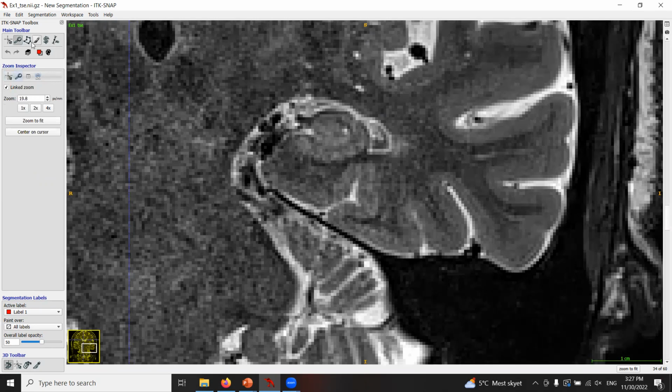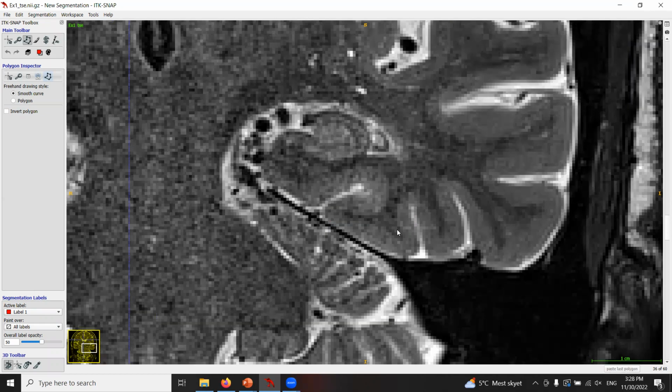Just to give you an idea what I would be looking at. So for this image, I'm just going for this hemisphere now. I want to see the dark band, so I drew on it here. And the outer borders. So I'm just showing you, when I would QC the MRI, I would not normally do this, but just to show you what I'm looking for. I'm drawing it a little bit messy, but yes, I think all the borders are clearly visible.